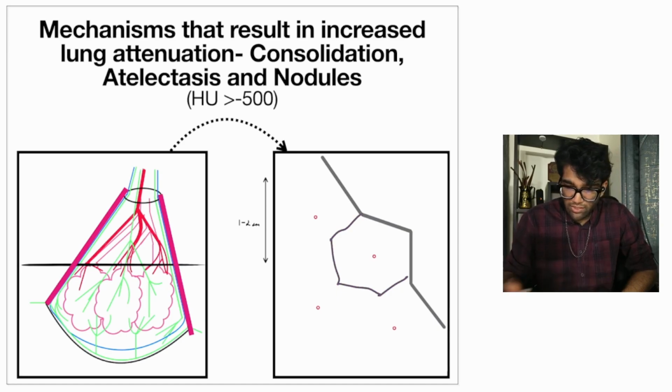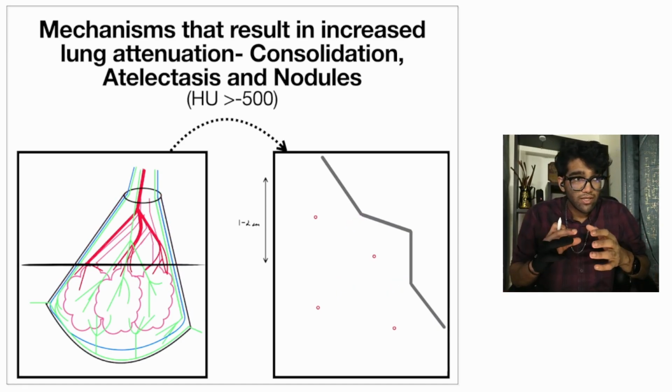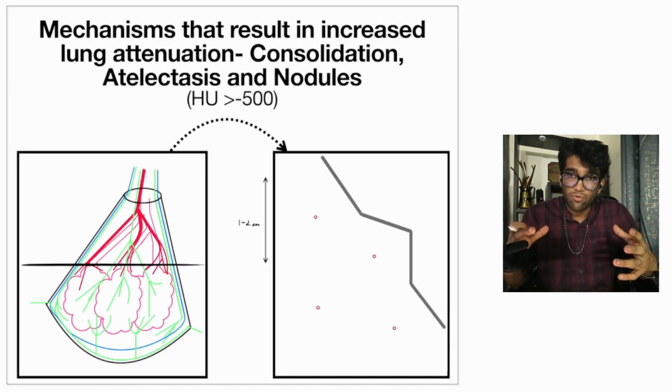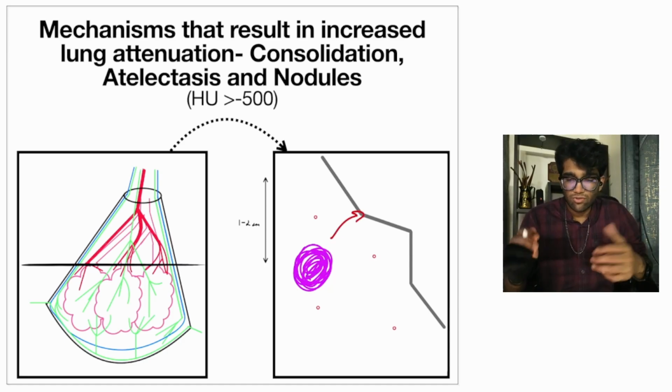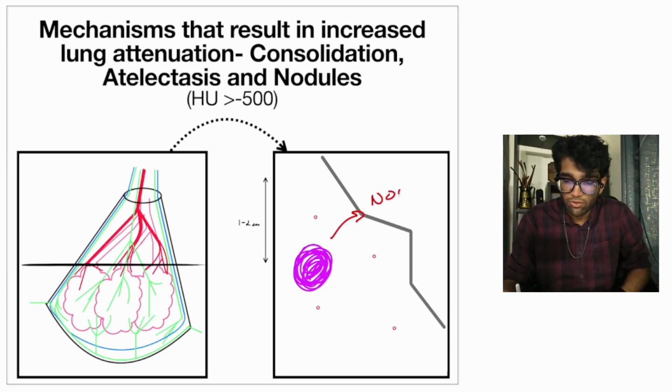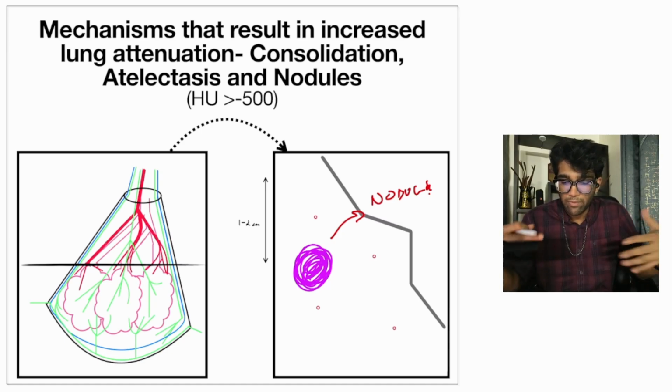The consolidation that we just discussed may be due to something that is putting a positive pressure around it, so it could form a round mass like this. This mass is then called a nodule. So a nodule is technically a variant of a consolidation, if it appears to create an outward pressure on the surrounding lung parenchyma.